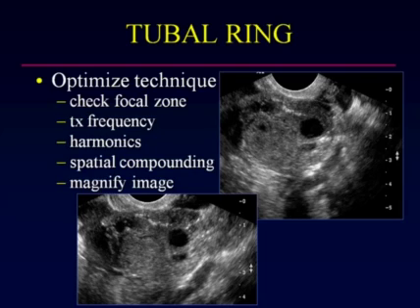So in this particular case of a woman who was pregnant with pelvic pain and had an empty endometrial stripe, you can see that there is an adnexal mass. It's relatively amorphous. The ovary is here. There's some hemorrhage here, a suggestion of a tubal ring and some adjacent free fluid.